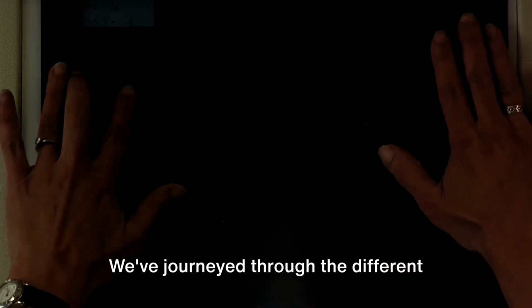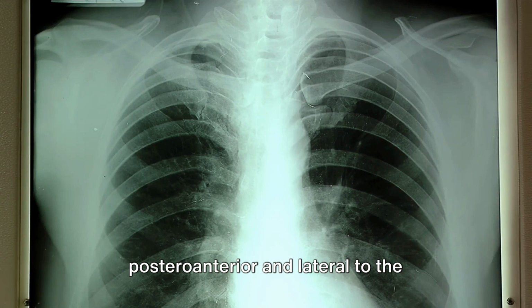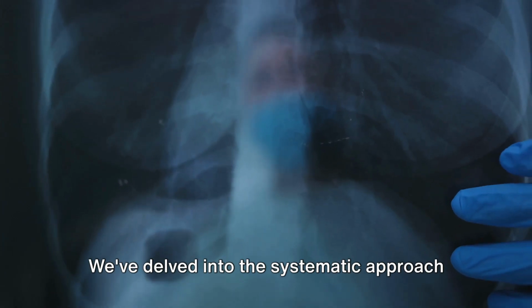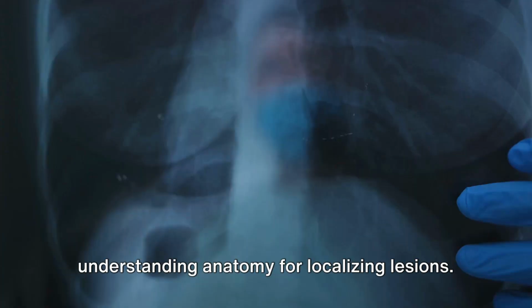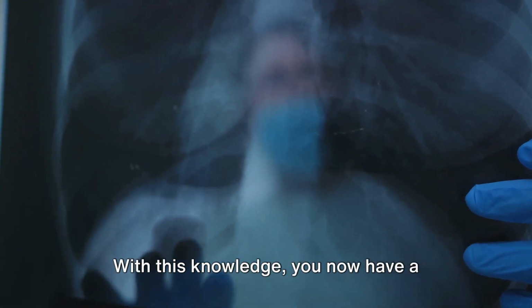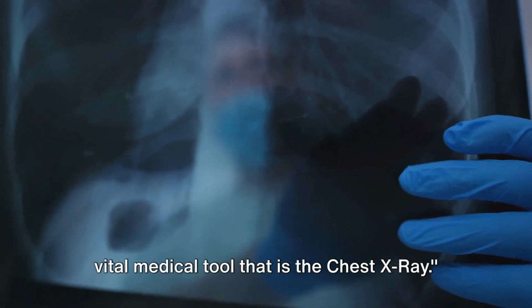We've journeyed through the different views of a CXR, from the standard posterior-anterior and lateral to the specialized Lordotic and lateral decubitus. We've delved into the systematic approach to reading a CXR from basics to detailed analysis, and we've learned the importance of understanding anatomy for localizing lesions. With this knowledge, you now have a deeper understanding of the versatile and vital medical tool that is the chest X-ray.